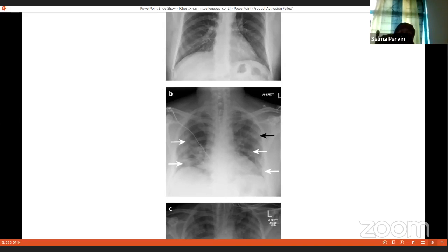There is peripheral pleural-based ground glass opacities. The initial presentation may be associated with septal lines presenting as dense linear shadows.